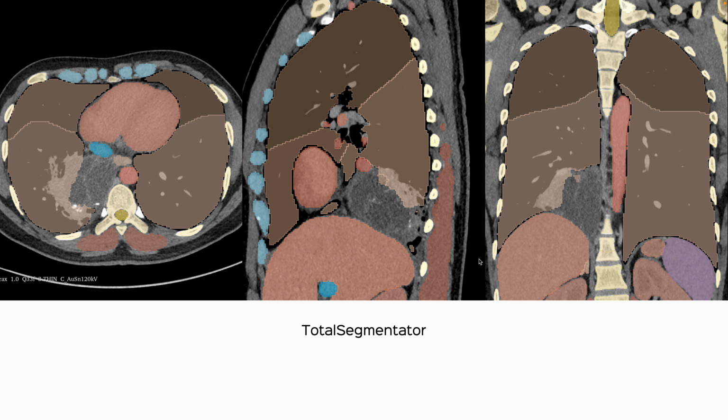Today, in fact, the reason I'm late is because I've spent about 3 hours trying to quickly learn 3D Slicer. And I did do a couple of quick tutorials a couple of weekends ago. And then there is a plugin for TotalSegmentator. And again, though the Mac Mini M4 has a GPU which is integrated with the CPU, TotalSegmentator doesn't believe there is a GPU, so it takes a little longer.